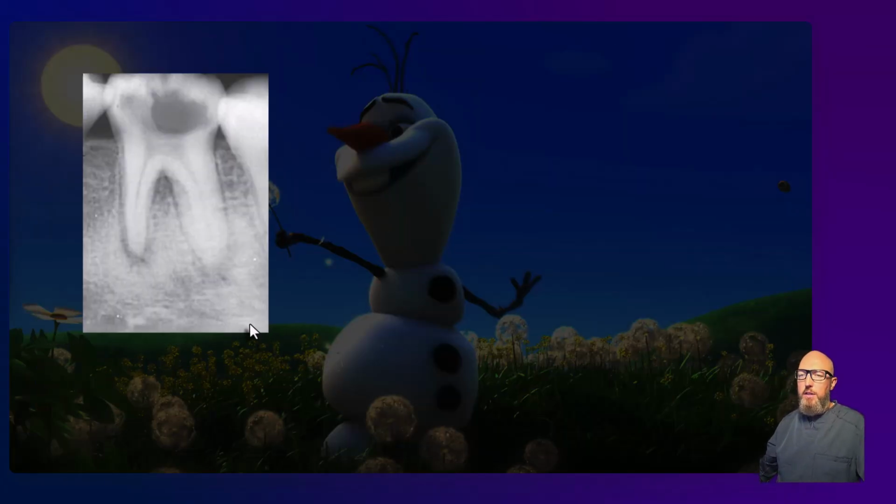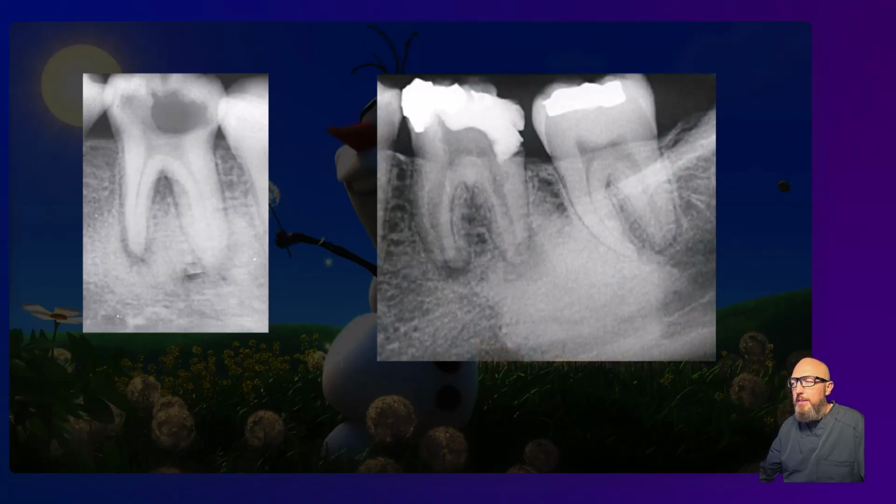What about in this case? Is this any different or just another idiopathic osteosclerosis? What's different here? We see little radiolucent outlines at the apices. We also see a big carious lesion, missing chunk of the crown here. That tells you there's probably infection with this tooth. So that's probably condensing osteitis. And over here, if you just focus on this area, it looks just like a dense bone island, well-defined, normal PDL space. But if you notice that there's radiolucencies associated with tooth 19, then you can probably surmise that this is reactive bone to that infection, and so this is condensing osteitis. Other than that, right there, this looks just like a dense bone island.